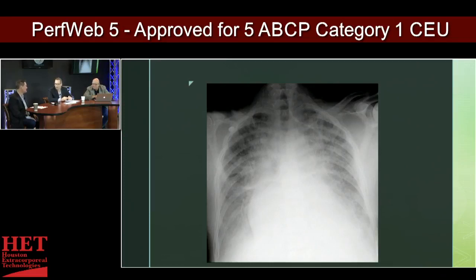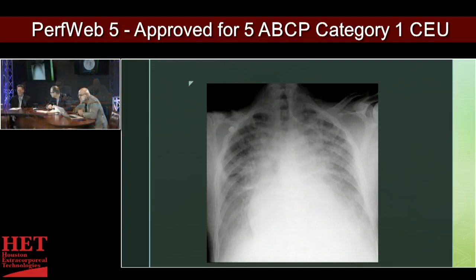The pulmonary hilar get congested, full of fluid, and so they become a lot more white on the x-ray, and so it blurs that distinctive line. You see that the heart is huge, so this patient probably has long-standing congestive heart failure, dilated ventricles, which lend themselves to CHF exacerbations. You also see the cephalization of the vessels, where you see the streaky lines radiating out in a kind of starburst pattern into the periphery.